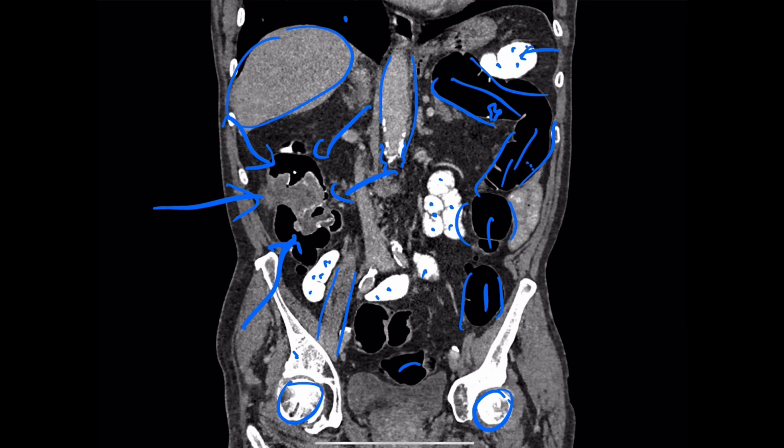So that's a really marvelous example of using a CT scan to make a diagnosis, Colin. Correct. You've nailed it. Yeah, we've nailed it. It's the first step anyway. Clearly, this needs further investigation and urgent colonoscopy to get some tissue to prove it's a cancer. But the nice thing about this is it also stages it, to see how advanced it is. Are there liver mets? Is there spread around the area as well? Correct. That's really important to know how far the tumor has advanced, and for students, it should inform management. I guess read about the Duke's classification for colorectal cancer.